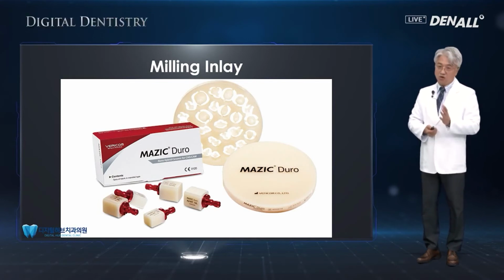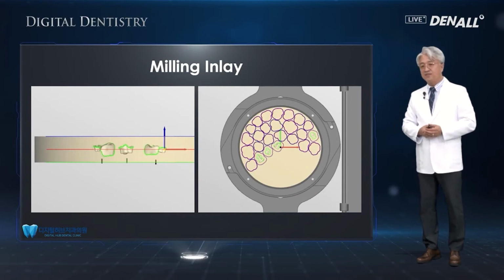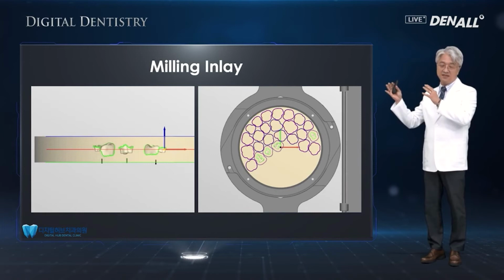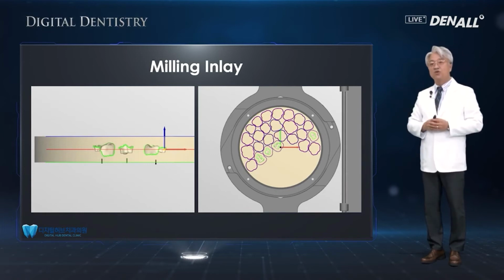So in this disc type or in the block type, the 3D STL file can be used to set the data and to do the cutting.